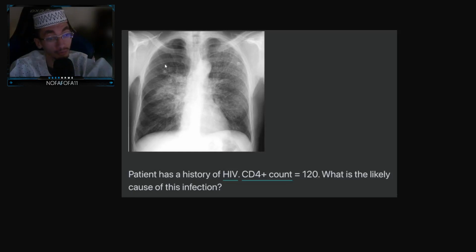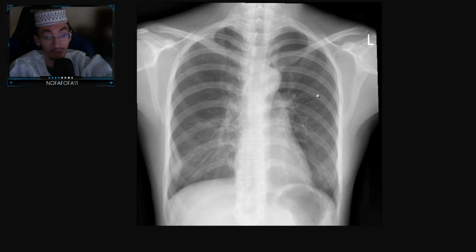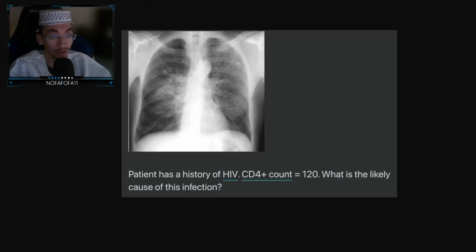They're very, very prominent towards the periphery. Also towards this side. Compare this picture to this picture. You can see the difference. We have pulmonary blood vessels that spread towards this side, but they're less visible. But if we look at this picture, they spread towards the periphery.